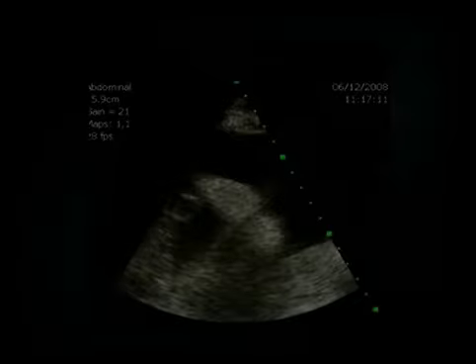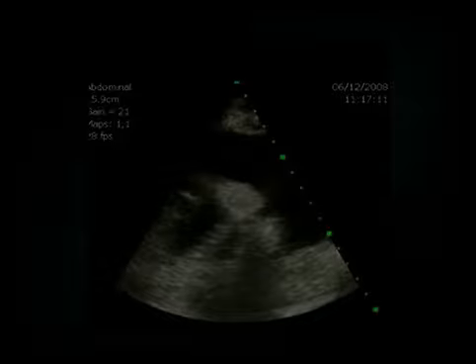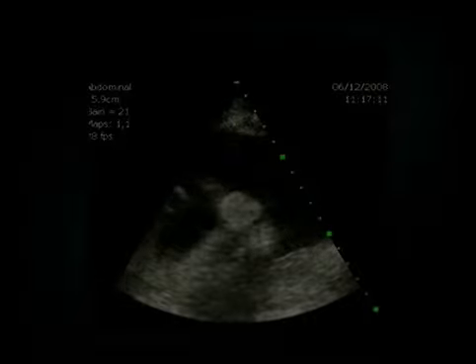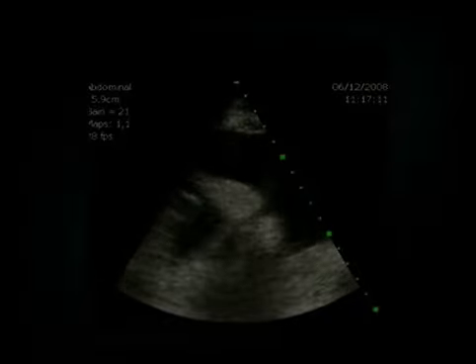The Acoustic P10 system uses a transducer which generates images in a sector format. These are generated at a frame rate of up to 28 frames per second to produce a real-time grayscale image.